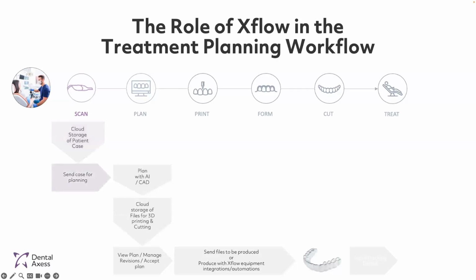With Xflow, you can send some of these scan files out for planning as you wish. And whether it be an outsourcing planning service like what Dr. Tania offers, or the AI service for retainer designs, or if you choose to design yourself using Vision, this integration accelerates the treatment planning process, optimizing efficiency and accuracy and having everything in one place.